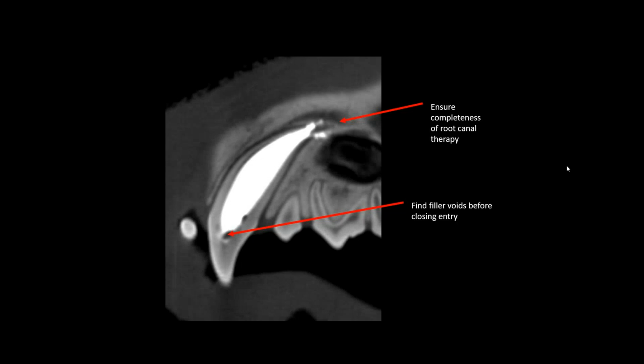In fact, there's a couple of those in a couple of different directions, which indicates that at the apical area there's more than one canal, which, the little delta area, is very common. And you start actually observing this sort of image, which in this case is a good feel on the cone beam CT quite easily. You can also see where the apex is.